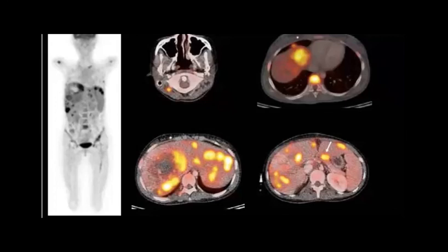Hyperdense. Nermeen, nice. Left iliac. Differential. And Alaa, left iliac bone. Okay, I agree with you. Continue, Marwa. We are hearing you. Vertebral, lumbar L5, L4 vertebra. Okay, this one, yes.